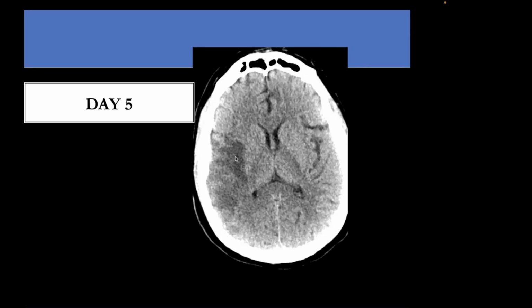Now, I want to touch on the terminology about edema. They talk about cytotoxic edema, vasogenic edema, interstitial edema, and so on. There are at least 5 types of edema. The one we think about most often is what we see with patients with, say, metastatic disease to the brain, where you see a large border of low attenuation around the metastasis itself. That is vasogenic edema.